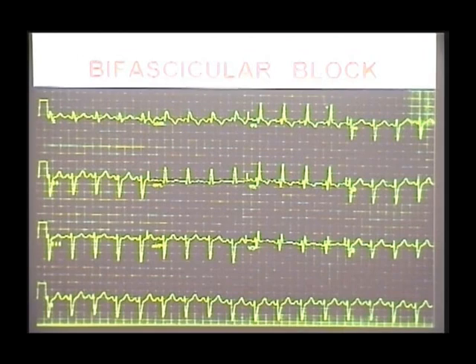So look at this ECG here. What fascicular block is here? LAFB is there because there is a left axis deviation. Remarkable similarity: the initial positivity and deep negativity in the inferior leads. So as soon as you diagnose a fascicular block, immediately go to V1 and see there. This is a dictum. Whenever you diagnose a fascicular block, go to V1 and see. What is V1 there?